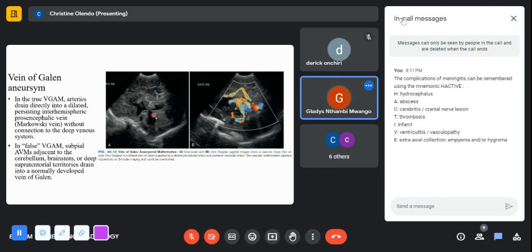But the main thing is, remember also there you have the brainstem, and because of the way the beam is going through, you may miss some part of the brainstem at that particular area. But the fourth ventricle does look dilated, and so does the third, where you can see the interthalamic adhesion. But what is important is what is seen in the posterior cranial fossa. There's a cystic lesion.